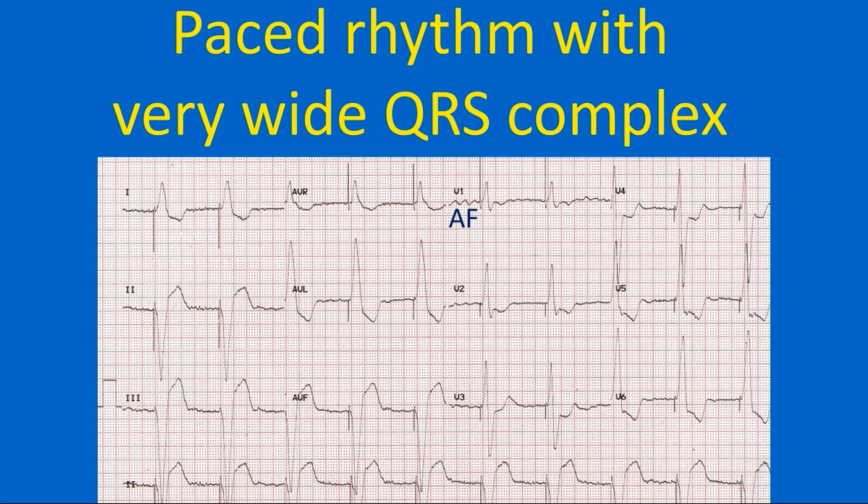The fact that the pacemaker has been implanted would suggest that there was an indication for pacing earlier. This person had left ventricular dysfunction and consequent atrial dilatation, accounting for coarse atrial fibrillary waves. The enhanced width of the QRS indicates higher amount of myocardial damage, which has led to ventricular dysfunction and a more disorganized intraventricular conduction.